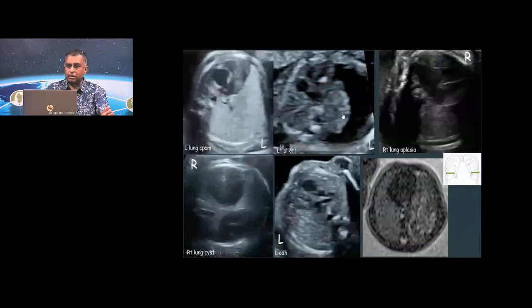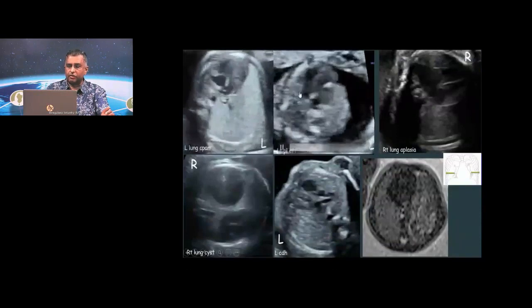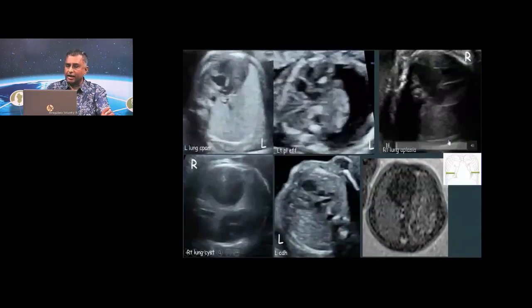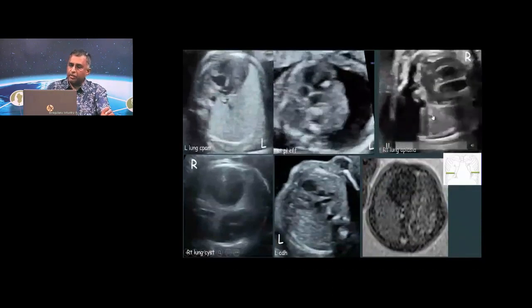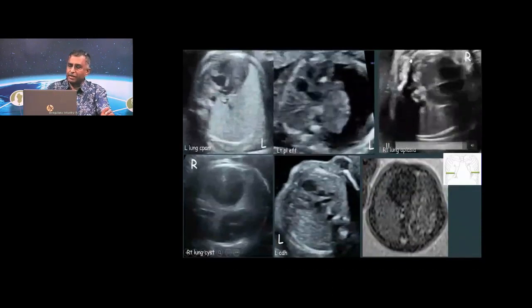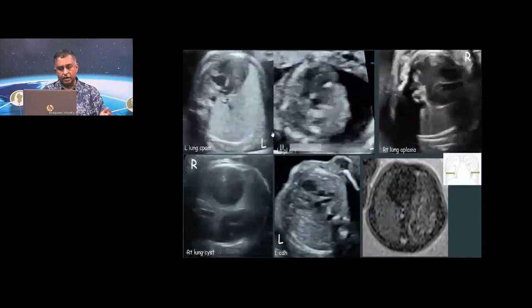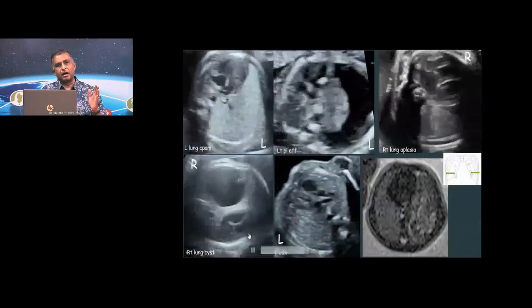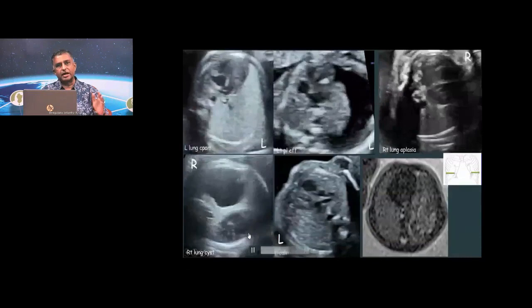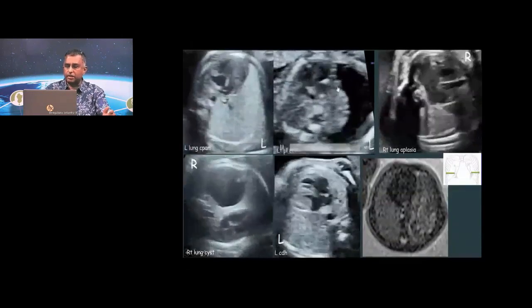Here is a pleural effusion under tension, and the heart is shifted to the right. Here is a right lung aplasia. This is a pull phenomenon, not a push phenomenon. The left lung is normal, the right lung is missing, and the heart has simply moved to the right side. So it's a pull phenomenon which has occurred. This is a bronchogenic cyst, right lung. The heart is moved to the left side, and these are all very, very evident cases. Let's stop these clips.